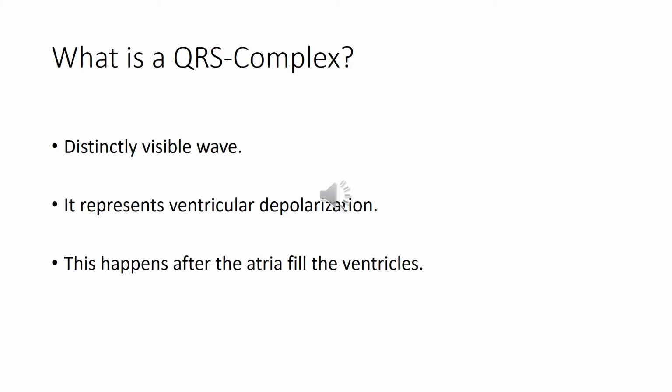The QRS complex is the firing of the AV node, and it represents ventricular depolarization, like I said. The Q wave is depolarization of the interventricular septum. So you're going to see this whole thing is happening in a wave-like movement. We're seeing this in the muscle contraction, but in an EKG, that's what we're seeing in this electrical tracing.